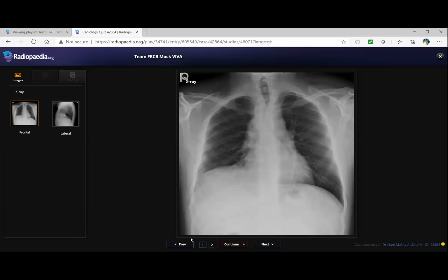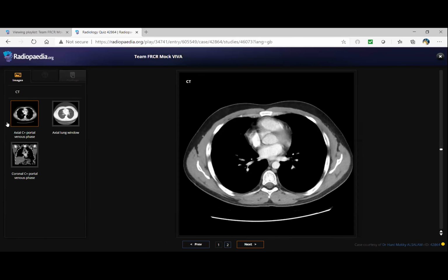Yeah, I'm looking at the cardiomediastinal contour. The aortic arch appears normal. I can see the right paratracheal soft tissue also. I think around the distal trachea, the soft tissue, there is thickening. Yes, so great. Okay, so this patient went for a CT.